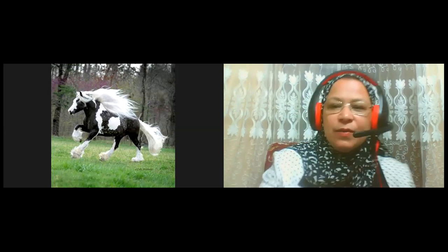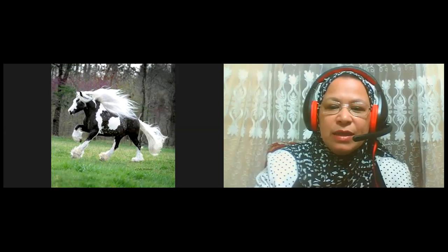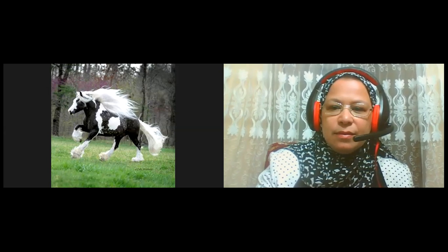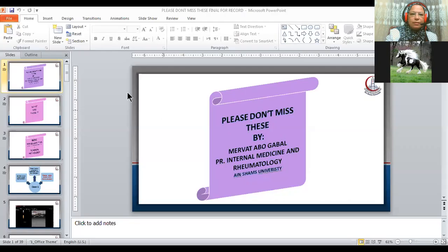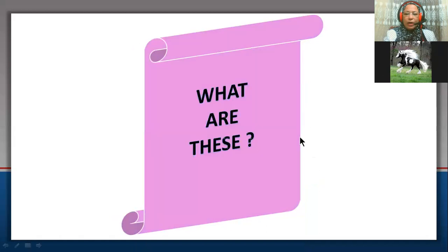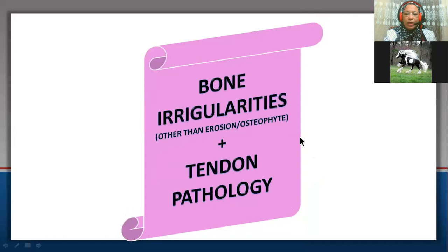My topic today is please don't miss these. These are a group of musculoskeletal ultrasound findings related to bone irregularities other than osteophytes or erosion, also related to tendon pathology.